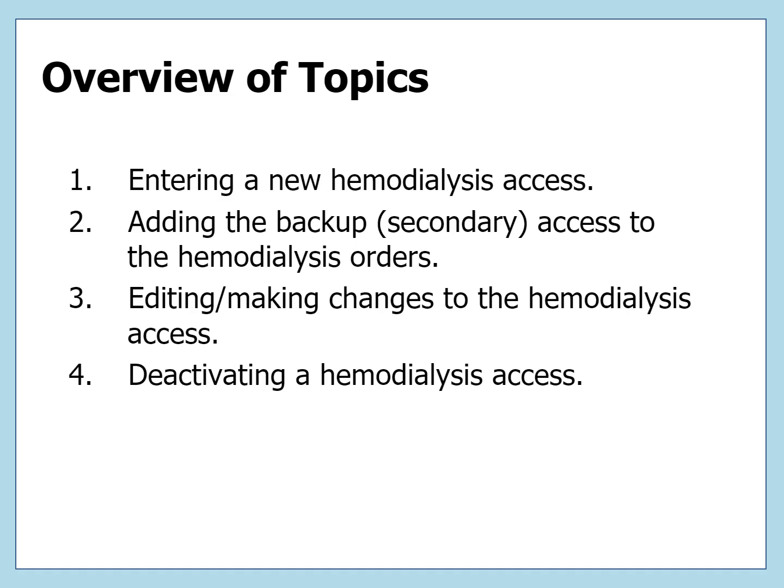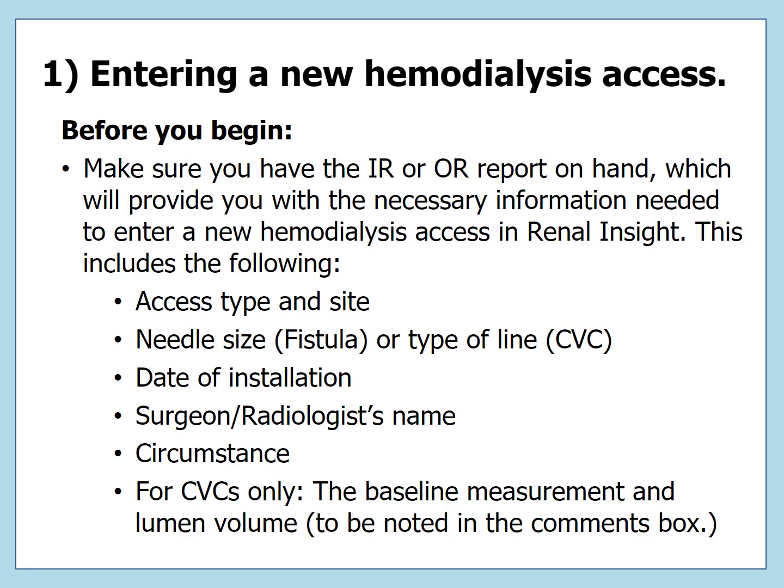The following slides will go into more detail for each one of these individual topics and will be accompanied by a video. When adding a new hemodialysis access, you will want to have the interventional radiology or operating room report on hand with the surgeon or radiologist's name, the date of the procedure, and the type and location of the access.